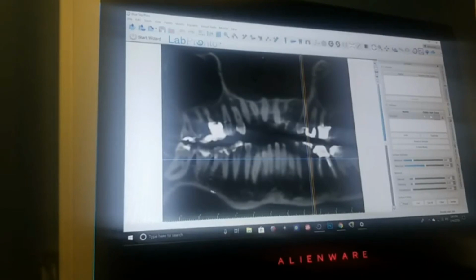Here is one area that you're looking at, an area where I don't see the bone anymore. I see bone, bone, bone, bone, I get here, and then it just kind of does this, and I don't understand why the heck this is happening in this area.